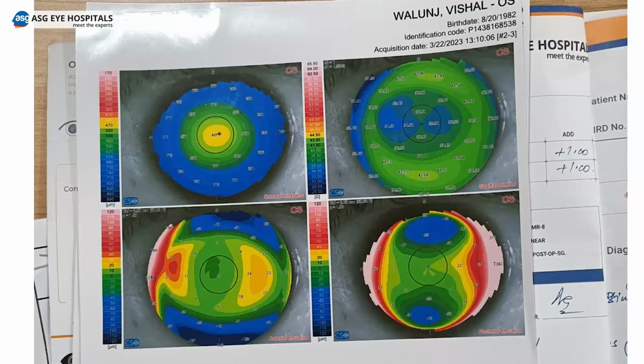Yeah, it's a post-refractive surgery map. But I also don't know the exact case. I've forgotten the case, but it's a post-refractive surgery map. And what is this thing, is it hot or is it cold? Cooler colors. But it is hotter than this, no? So that corresponds to this blue.